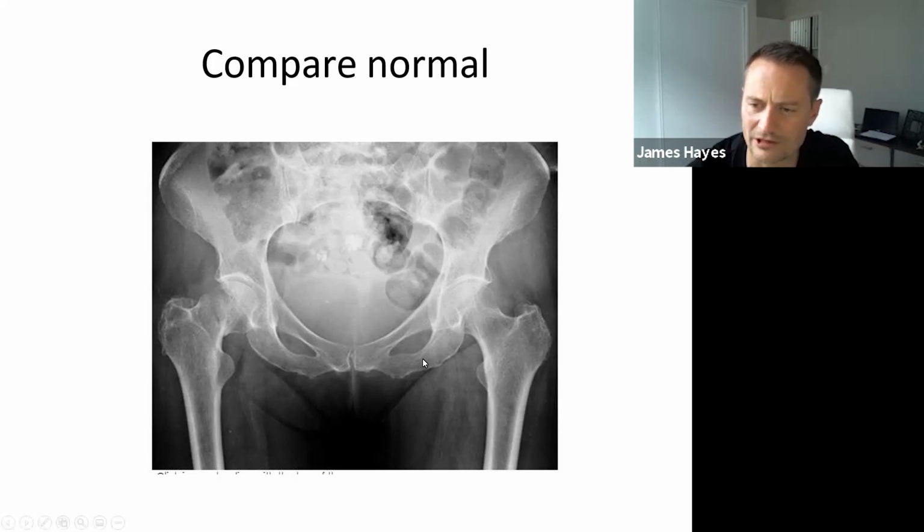we go to the normal side to begin with, the non-pathology side, this little bump here, the lesser trochanter, it's much bigger here, okay? So remember, all of these views are just 3D images based onto 2D. So you have to imagine that if you turn a bump away from the inside, so you're turning it laterally, that bump's going to get bigger. If you turn it completely inwards, it would more or less disappear, kind of like the non-pathology one.